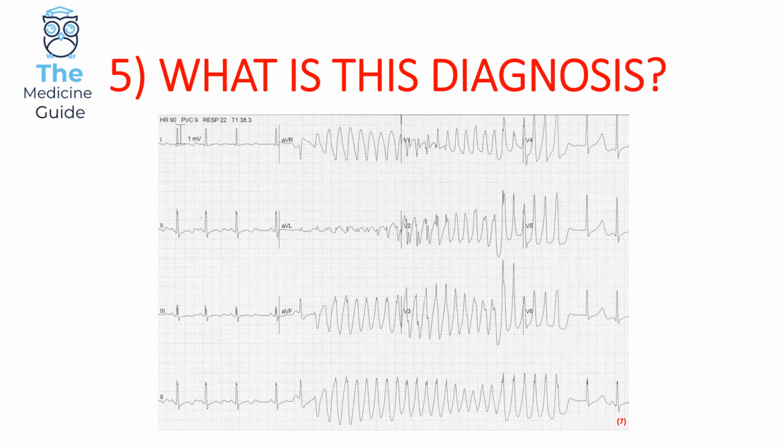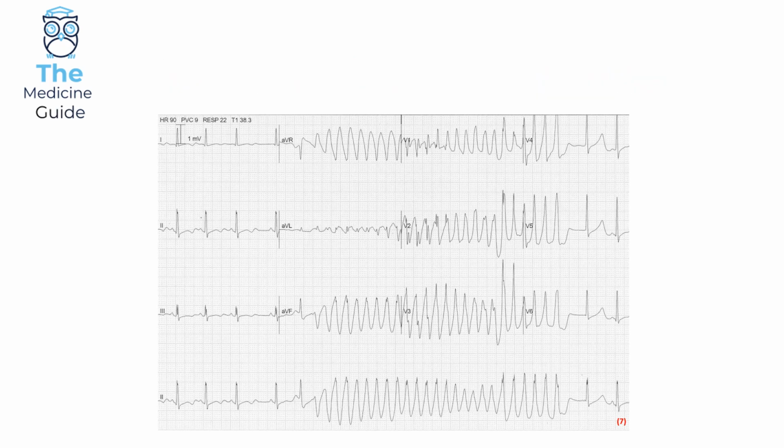Okay, so this is the final ECG, and this one should be a little bit easier. This is a spot diagnosis, so I'll give you about 10 seconds for this one, and you can either choose to pause the video or you can wait 10 seconds. The choice is yours. Okay, let's find out the answer.